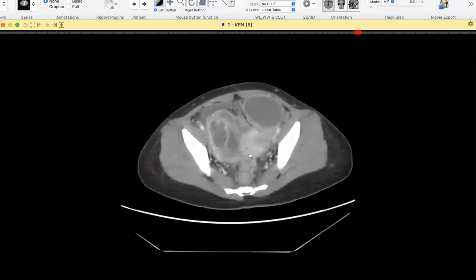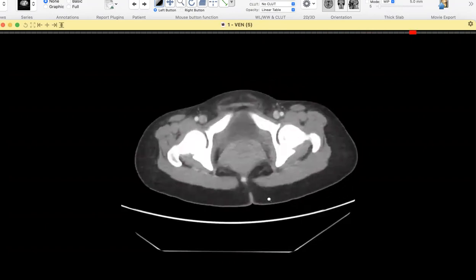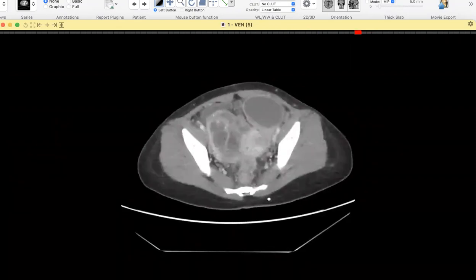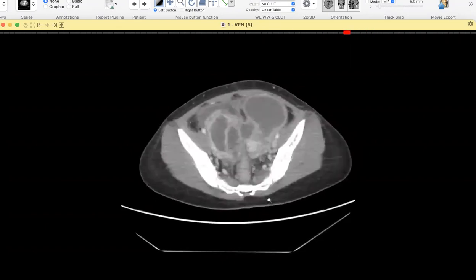Yeah, just dilated fallopian tubes, enhancement, some ascitic fluid, fever, inflammatory markers. So these are all characteristic of tubo-ovarian abscess. Sometimes candidates confuse it as multicystic lesions, and they tell the differential in that line. So that's why I just showed it.